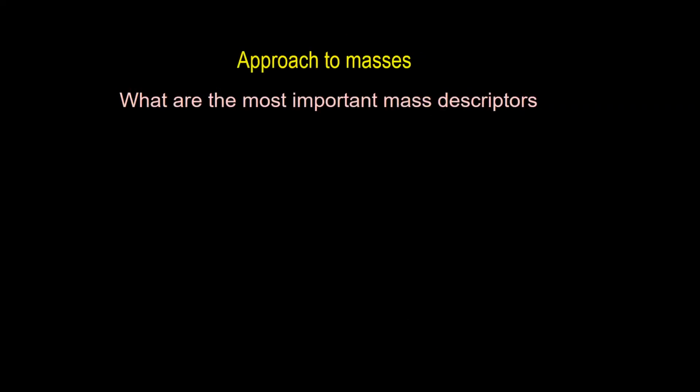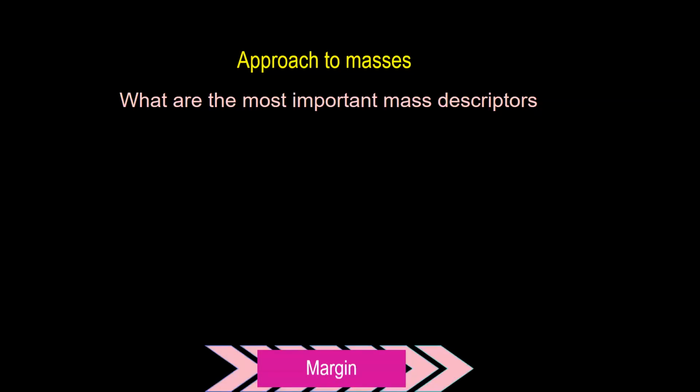Okay. What are the most important mass descriptors? Just as a reminder, the most important descriptors are margin, shape, and density.